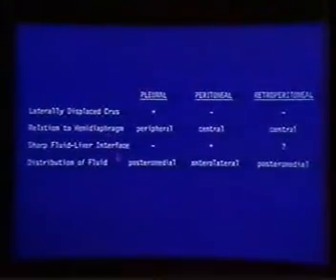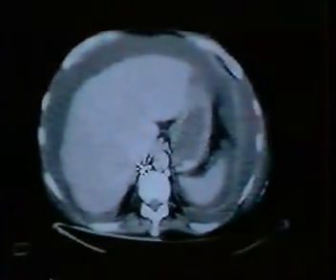Second sign relates to the hemidiaphragm. That is, if you can see the ipsilateral hemidiaphragm, as you do here, a curvilinear structure, when you have fluid along the outside of it, peripheral to it, that's pleural fluid, and the fluid that's central to it in here has to be in the abdomen. And this is just a consequence of what it's like to get transverse images through a curved structure. Of course, the diaphragm normally is convex upward, and so as you cut across it, anything along the inside of it is in the abdomen, anything along the outside of it is in the chest.